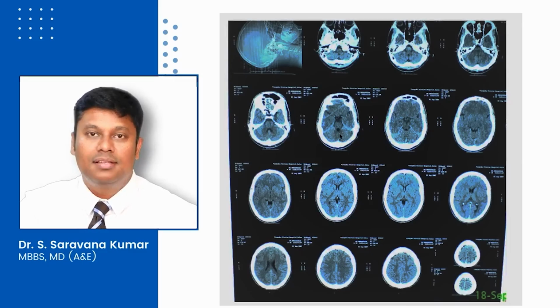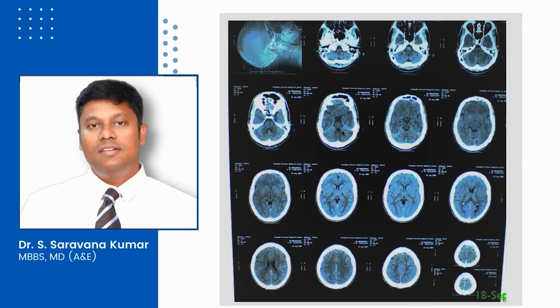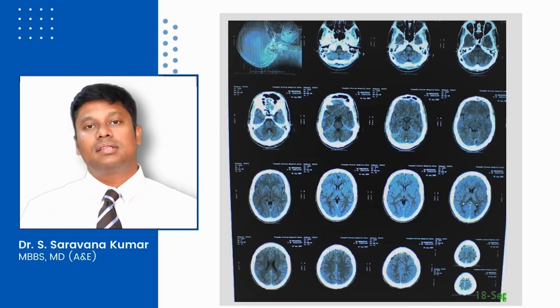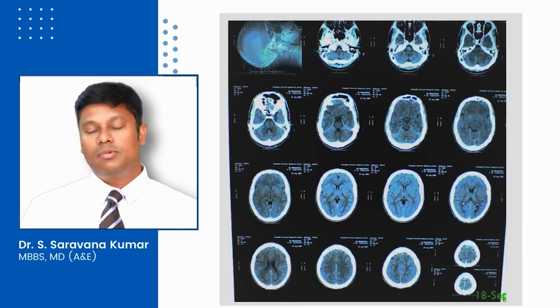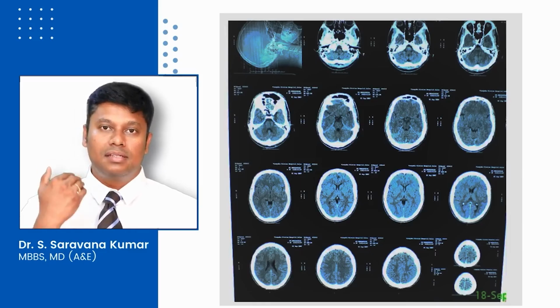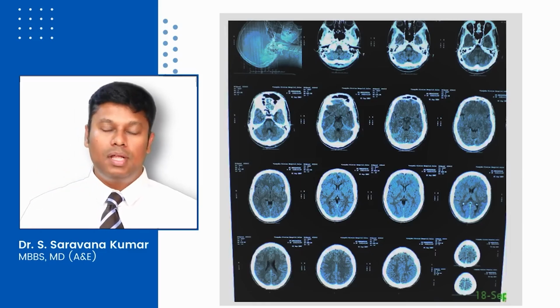As such, you can see the midbrain in the center. So this is how you identify the brain stem in a CT image. As you can see, the first 5 or 6 slices, depending on how thick your slice is going to be, are going to cover your brain stem. You remember the 3 parts of the brain stem: midbrain, pons, medulla. As the scan is done from below upwards, you are going to start with medulla, followed by pons, followed by midbrain.